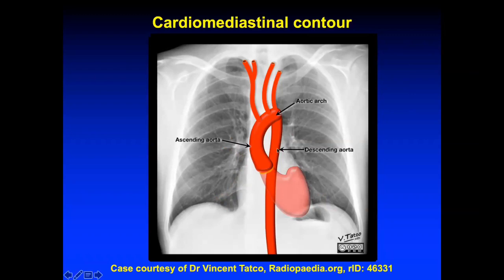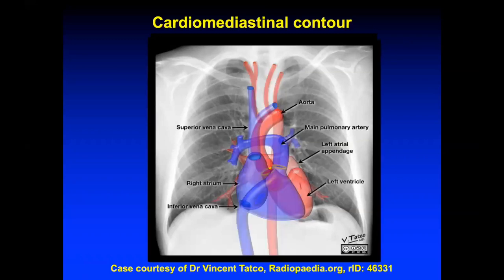It is always seen within the cardiac shadow. Whenever you have aneurysms, sometimes then it can be visualized. So you should know how this is normally appearing. This is the normal anatomy of various cardiac structures on an X-ray. So when you superimpose everything, this is how it appears.